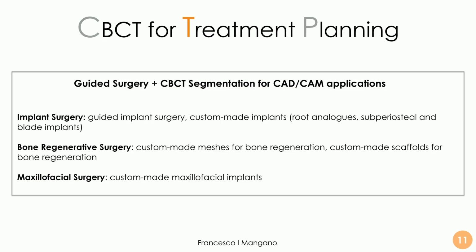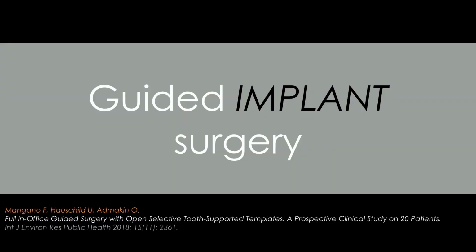We can design, over segmented bone, over 3D bone reconstruction, root analog implants, subperiosteal implants, blade implants. We can design meshes for bone regeneration. We can design scaffolds for bone regeneration. We can design personalized implants for maxillofacial purposes. Let's see how it works with some examples.